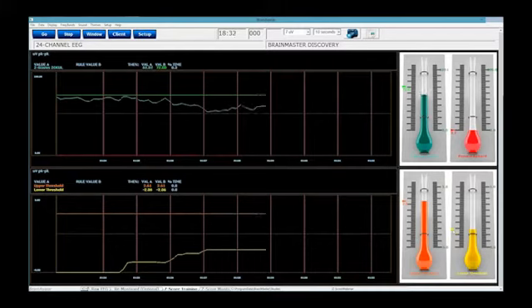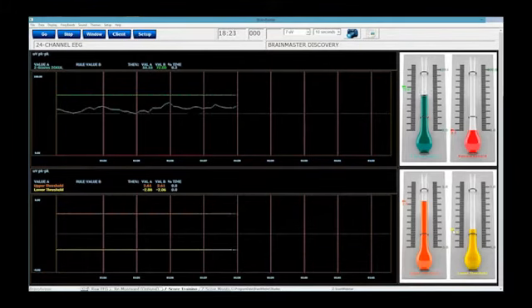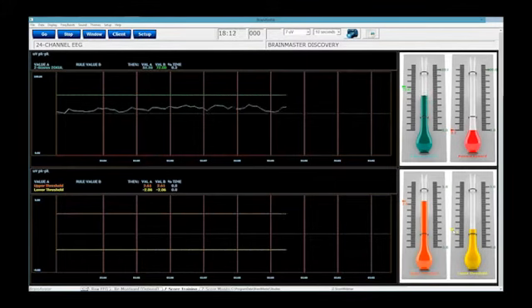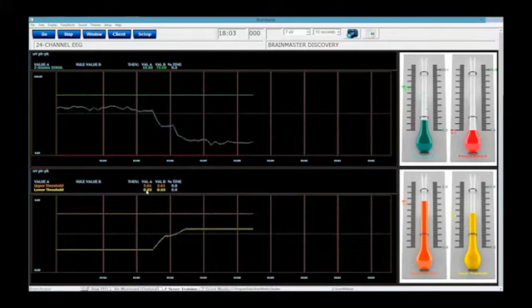Once again, ZOK, one threshold, no variation on it. ZOK UL, two thresholds. Now you have a varied upper and lower. Now you've got to ask yourself, why would I want to do that? Well, maybe you want to focus on higher Z-scores, so you really don't want to look as low as you're looking. You can technically have a focus on positive standard deviations in both ranges.